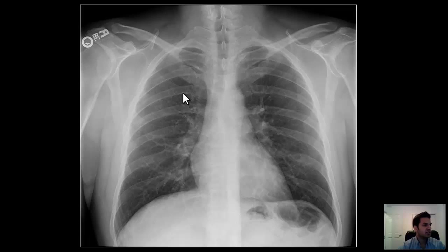You want to look at the pulmonary vasculature. So you look at the pulmonary vascular markings and make sure that they're nice and thin and pencil sharp and not dilated and fuzzy to suggest pulmonary vascular congestion or edema. And then looking medially, you will see these nodular radiodensities here, which are vessels on end, and that's how you know that they're not pulmonary nodules. Pulmonary nodules would usually be more peripherally shown on a chest radiograph.